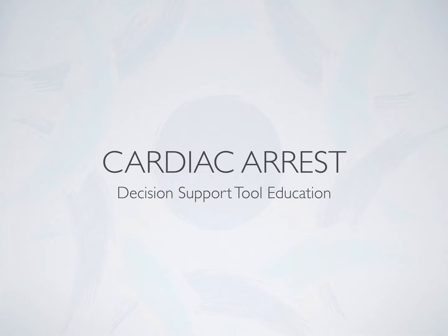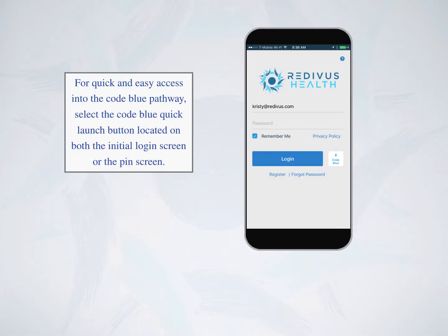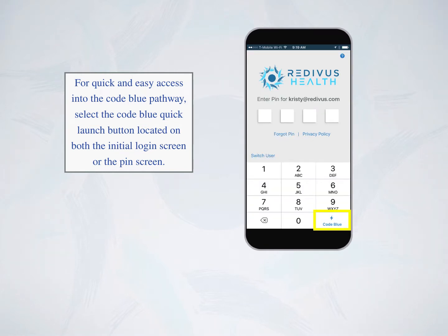Cardiac Arrest Decision Support Tool Education. For quick and easy access into the CodeBlue pathway, select the CodeBlue Quick Launch button located on both the initial login screen or the pin screen.